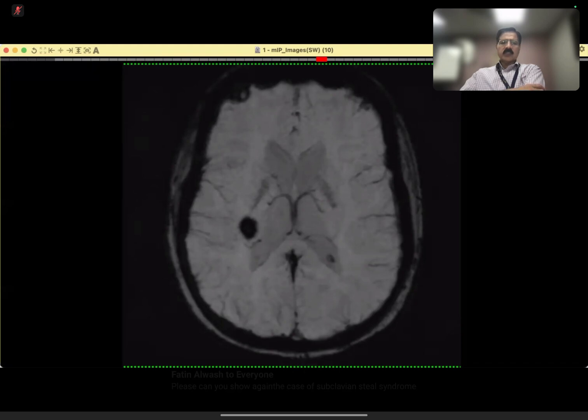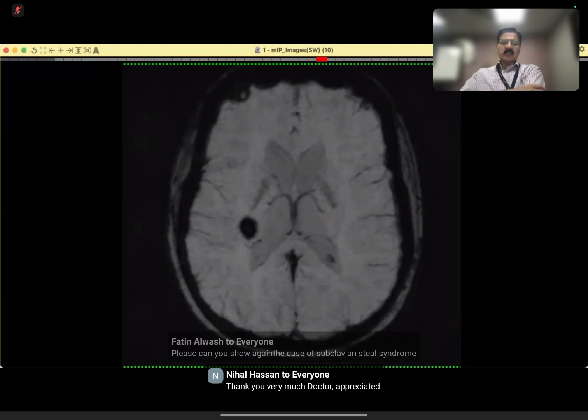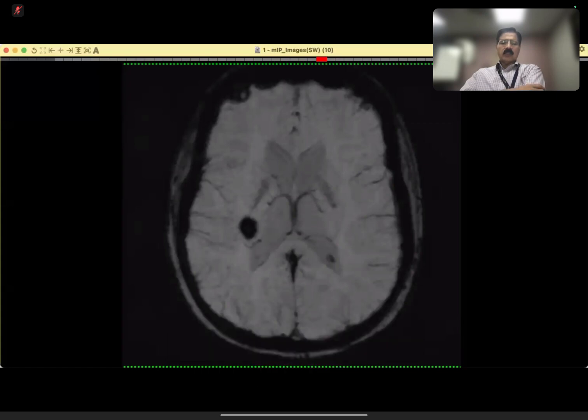Today we did chest X-rays. These were classical exam cases, and which are observation films. And many a times these might be the first case in the exam, observation film. But one of the key points which I want to highlight is that a very simple differential diagnosis becomes a difficult case if you don't handle it correctly.